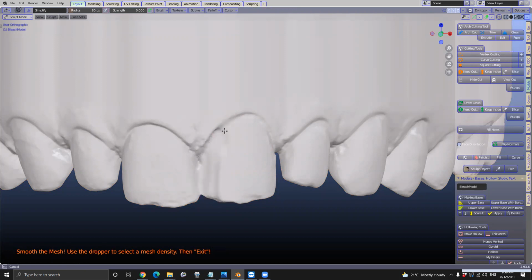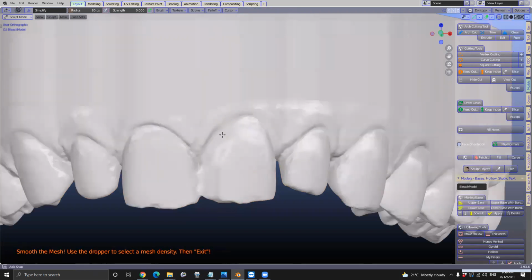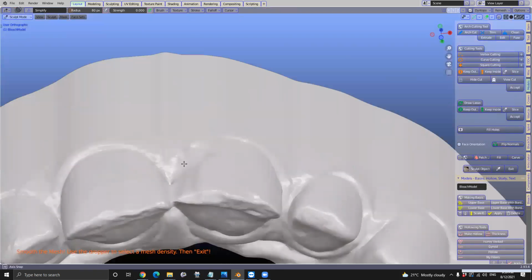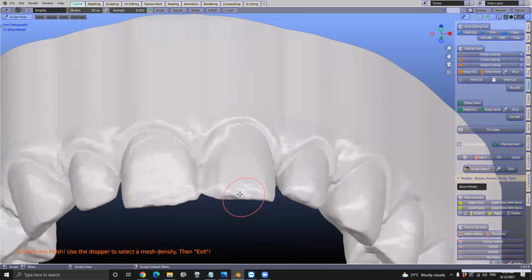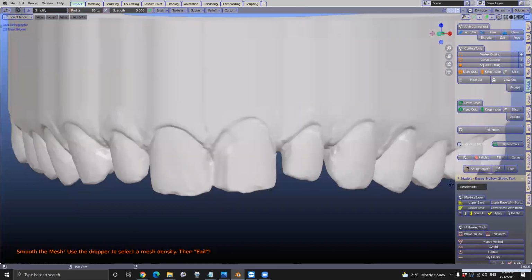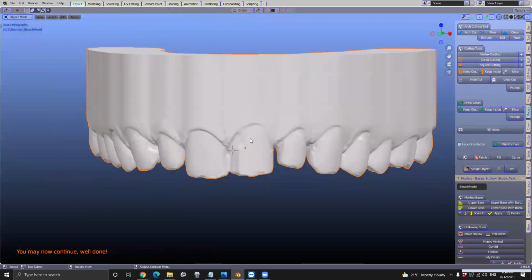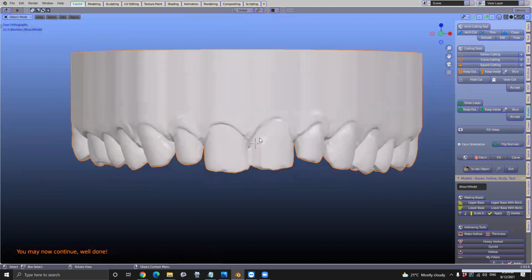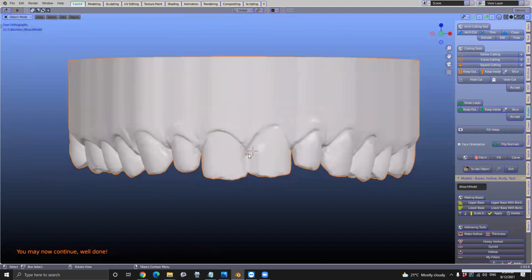Okay. So here we've actually carved away, and we would do that in the dental lab as well, because we take a burr and nip off for a diagnostic wax up where we need to take away. So this model could actually be printed as well, and then you can just mark where the adjustments have been made. Yeah, correct.